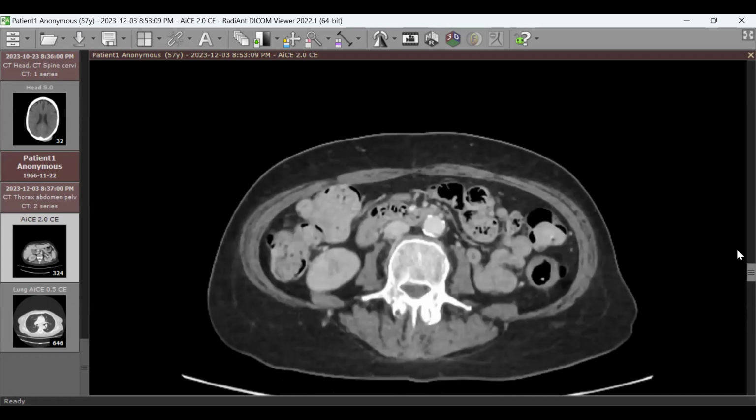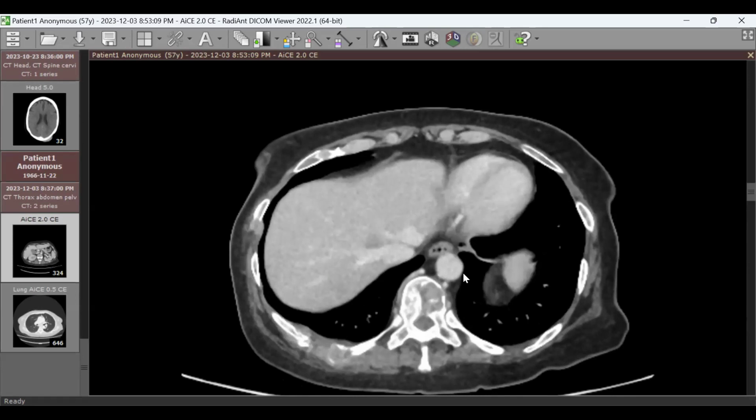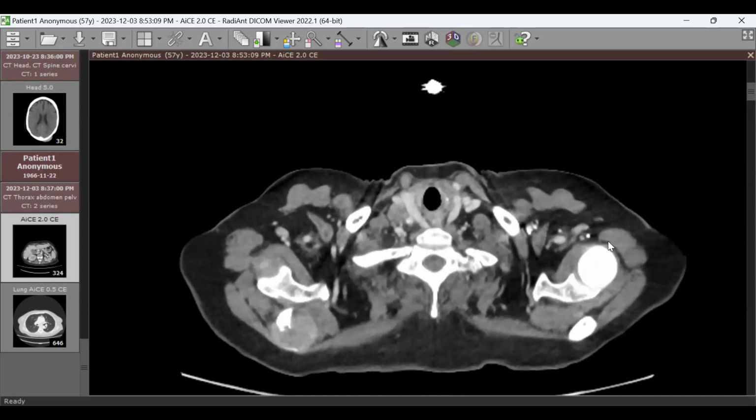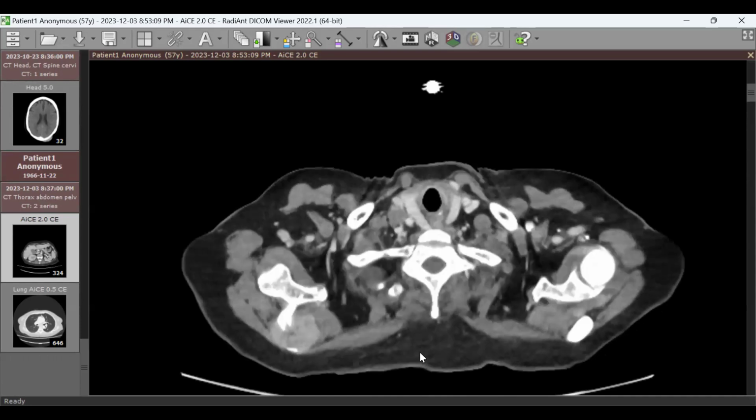And so usually when we have these cases, we discuss them at the multidisciplinary team meeting. You describe the case to them, you tell them the patient had this and that, and this is the staging, you show them the lesions. And the other thing they want from you is the potential route for biopsy. So if I show you this image here, from this image, what are the potential routes for biopsy? You mean any route of biopsy? Yes, any lesion.